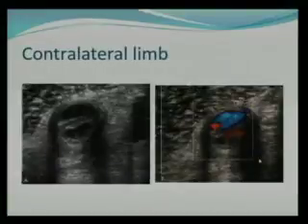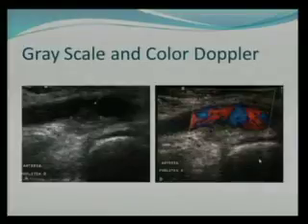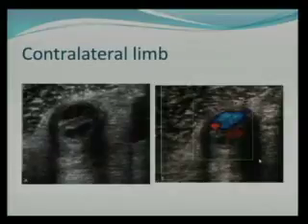So this was a patient in which this was seen on maybe the right lower extremity. You see a clot here, and there is color flow aliasing with a persistent filling defect. And on the contralateral limb, because of chronic erosion of the arterial wall, there is now a pseudoaneurysm that has formed. So chronic abrasion of the popliteal artery against a tendon, a popliteus muscle, or the medial head of the gastrocnemius muscle has caused a pseudoaneurysm over time, and this is what it is.